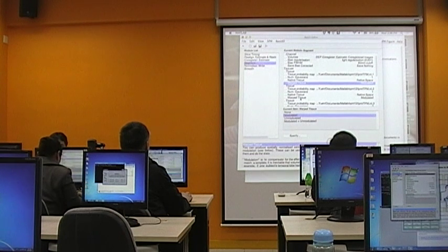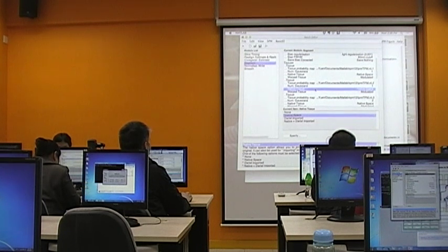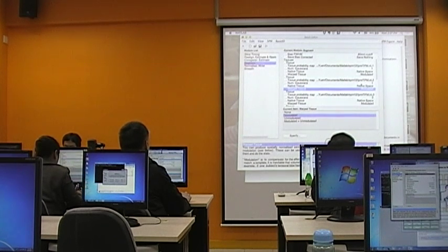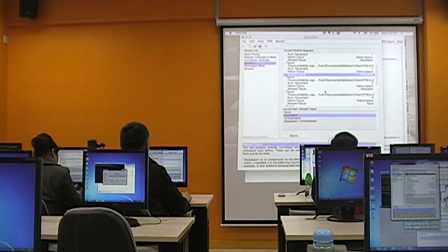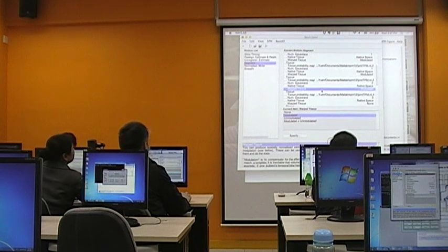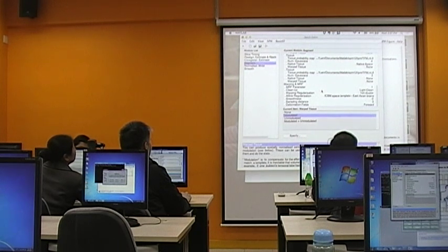Okay? And the same for the second tissue class, which is white matter in this case. Again, you would like to have the modulated white matter probability map after segmentation. And I also choose to have the modulated normalized CSF. Okay, so this is not definitely or absolutely necessary, but I think it would be just nice for you to see this also.